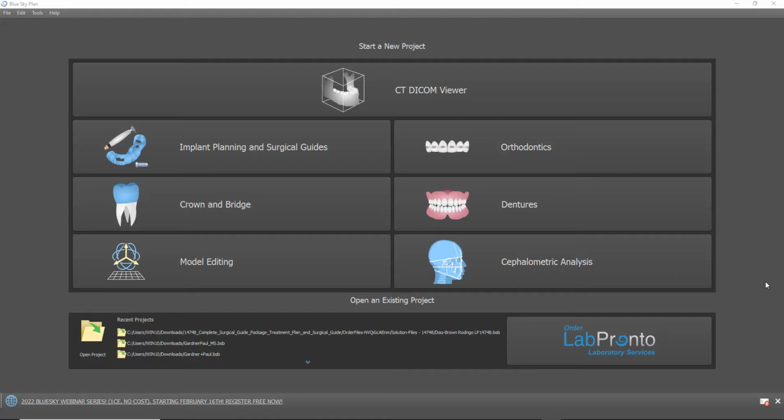I was recently contacted by a dentist who made a comment, hey, wouldn't it be great if BlueSkyPlan allowed you to design a crown and a bridge directly in the software? And my response, of course, was it does. So I'm creating this video to demonstrate some of the functionality.